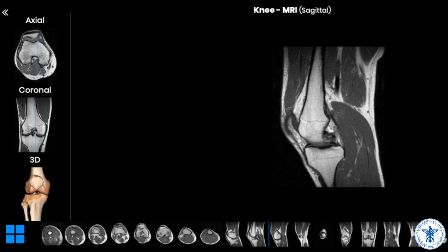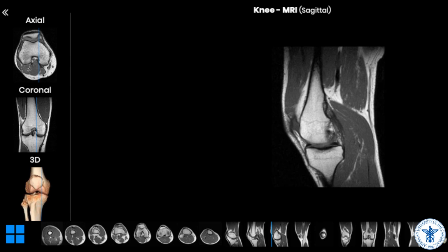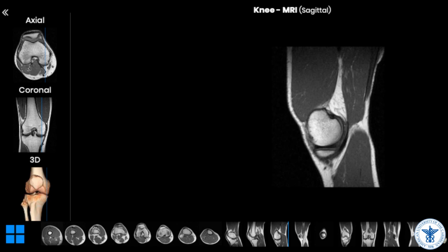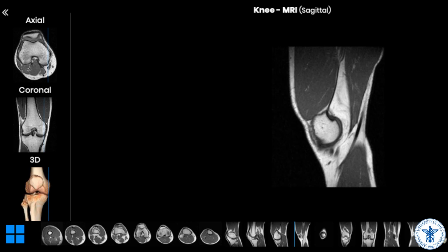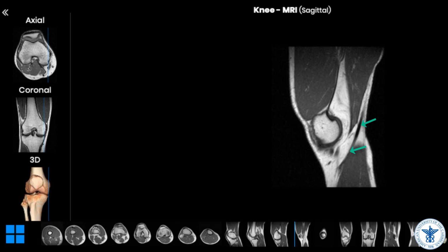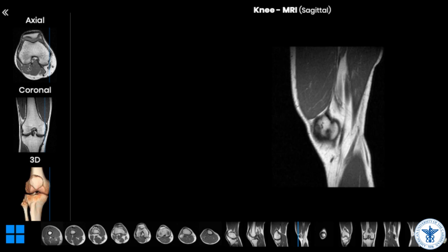Well, and we are going to the medial side. This is the medial head of the gastrocnemius muscle and the anterior and posterior horns of the medial meniscus. Now we're gonna see some tendons around, and this one, the first one, belongs to the semimembranosus muscle. Remember, it reinforces the joint from behind. And the other tendon, which also descends down here, this band, belongs to the semitendinosus muscle. And we also have the other two, the tendons of sartorius and gracilis.